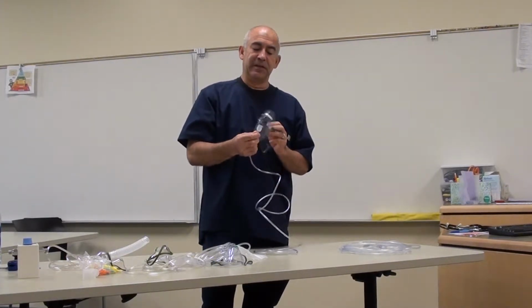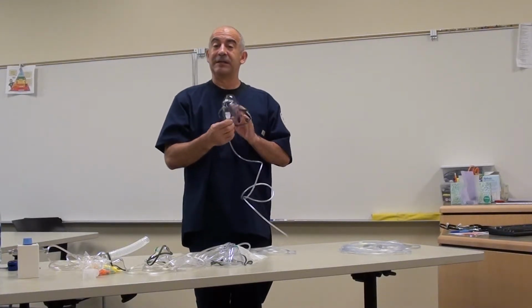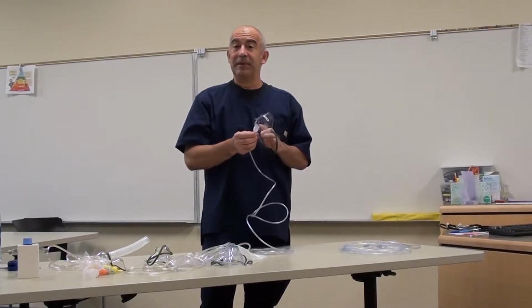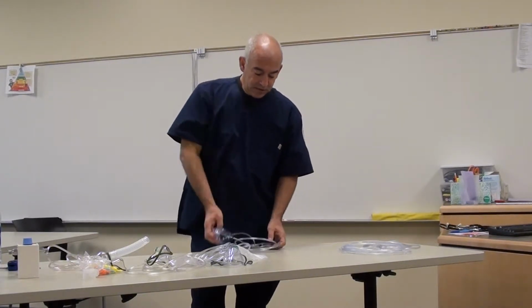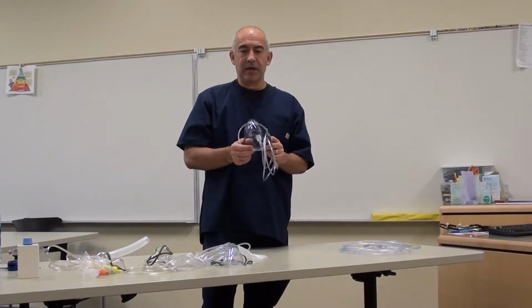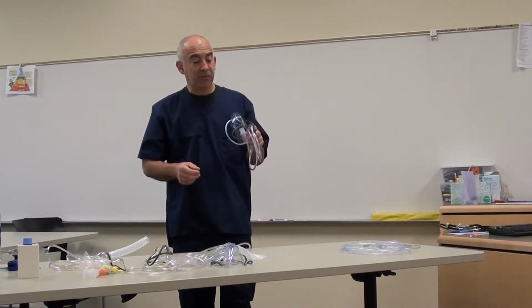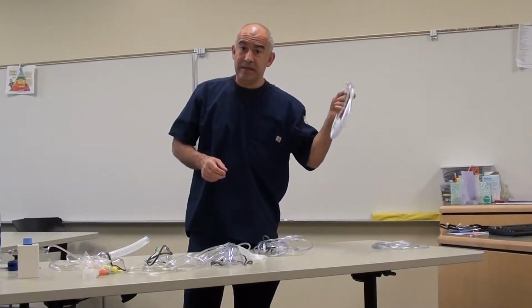A disadvantage of this particular device is that it can be uncomfortable for some patients, especially those that are claustrophobic, that want to take it off all the time. And then there is a suffocation hazard. If somebody vomits into it, they can breathe in their own vomit and suffocate. Best uses for this are for emergency patients and for patients requiring moderate FiO2 for short terms of oxygen therapy. This particular device does not require humidification, and just for clarification, neither does the reservoir cannula.